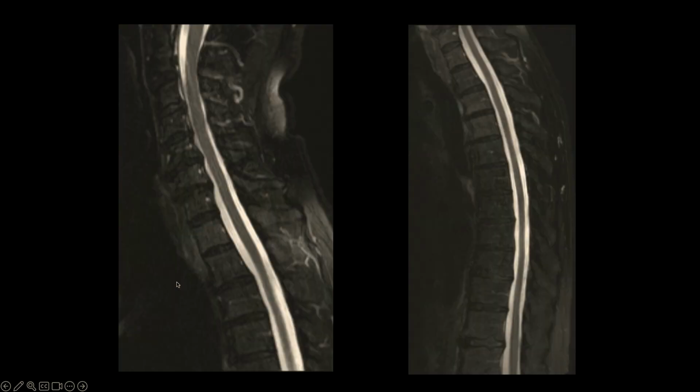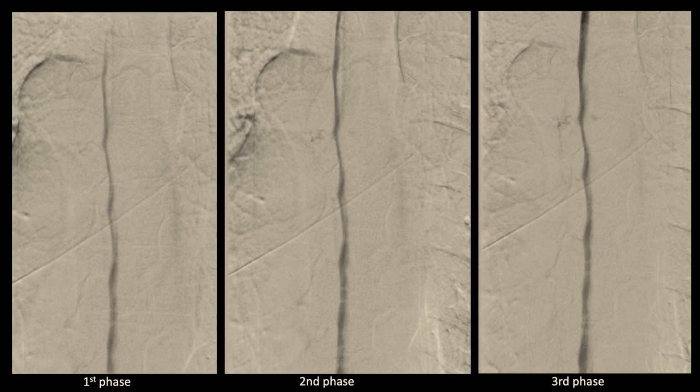Patient went on to total spine MR. These are T2 fat saturated images again, and we did not see anything that looked convincing like a SLEC. So now we're SLEC negative. We think there's a slow leak. This is going to be a type 3 leak, CSF venous fistula. So we're going to bring the patient over to fluoro and do a digital subtraction myelogram.